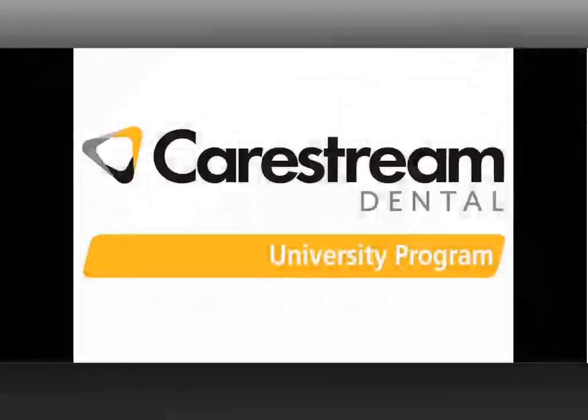Hello, this is Jordan Reese, U.S. Sales Director of 3D Imaging with CareStream Dental. And I'm here with Dr. Shailesh Kottal as part of our CareStream Dental University program. Today, we're going to do a CBCT anatomical review of the mandible.